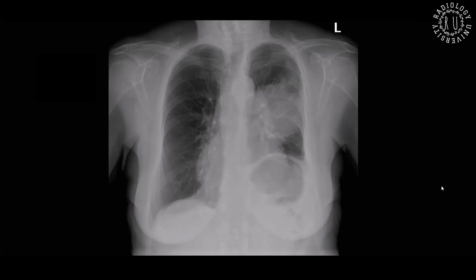What else can cause the left hemidiaphragm to be elevated? Usually, which diaphragm is elevated? I would like to know if this patient has a prior surgical history, because a lobectomy could also give rise to a reduction in the left lung volume. Which hemidiaphragm is usually up and which is down? Which is elevated usually in normal people?